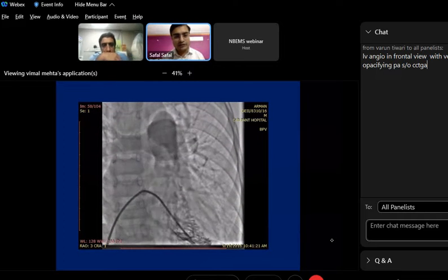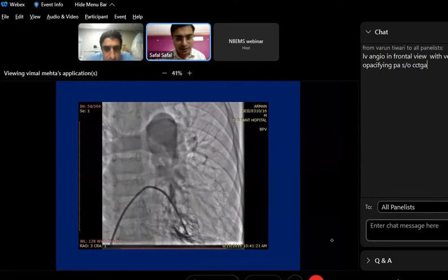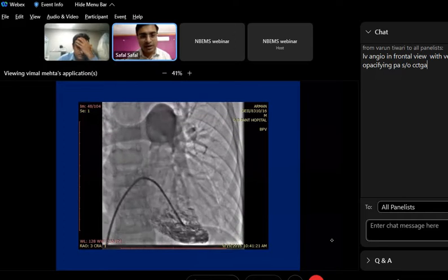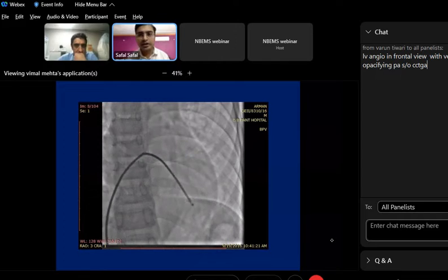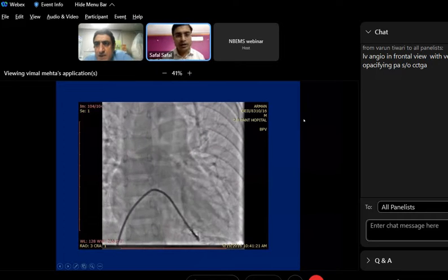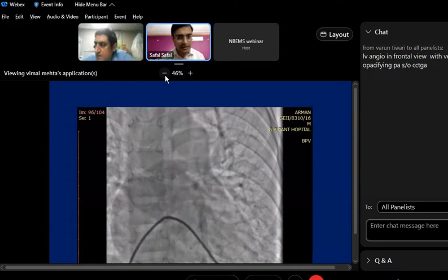Secondly, a lot of you have said that this is the left ventricle. Now, sir showed you the left ventricle. So smooth it was, in last time's work, the first video he showed. So smooth, and look at this ventricle. So this is definitely not the left ventricle. A number of answers say this is a left ventricle to the pulmonary artery, and I don't know what all. We have a lot of such answers. So this is classically what the right ventricle will look like. And beyond that, obviously, you look at the infundibulum, and you obviously look at these thickened valves. And beyond that, sir has already discussed.